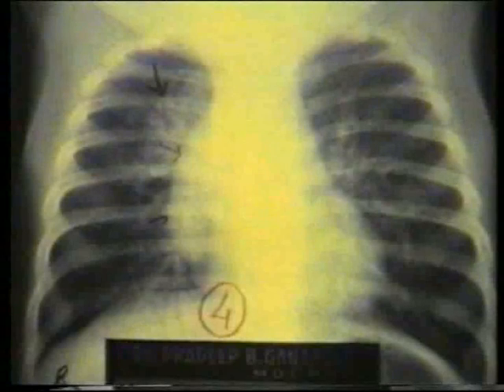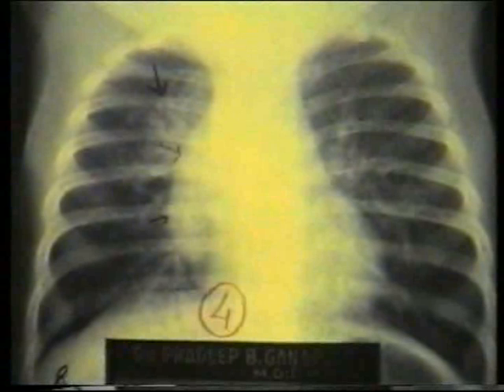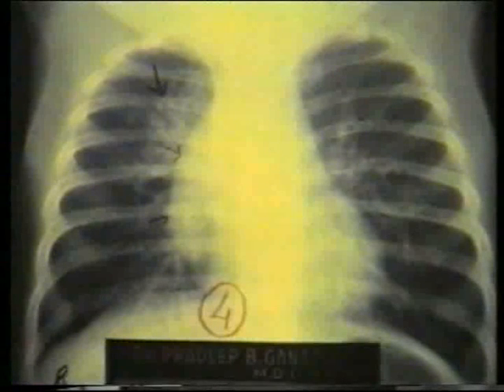This was a mediastinal mass in the anterior mediastinum. In this region, it could be a thymus, a lymph node mass, or a teratomatous dermoid. This mass has a typical tiny notch shown by the arrow. This notch is typical of thymus. This was a thymic mass. Note the notch again.